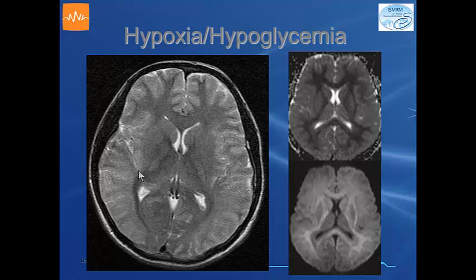And the T2-weighted MR image was a little odd, but on the DWI and the ADC, you can see that there is very extensive white matter, decreased ADC due to delayed anoxic leukoencephalopathy. And this has been quite well described in patients with anoxia, particularly carbon monoxide poisoning.